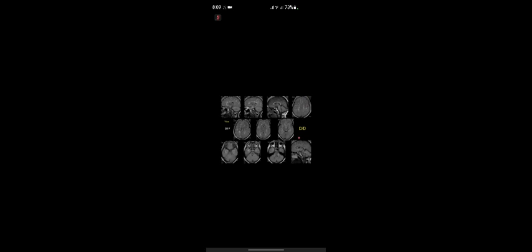So, please continue. And recommend post-contrast imaging to see if there's any enhancement of these lesions as well. Okay, let me give you a hypothetical scenario. The optic nerves are normal in this case. On post-contrast, there is no enhancement. The patient has neurological symptoms, and this is the first presentation. What do you think is your diagnosis? What is your differential?